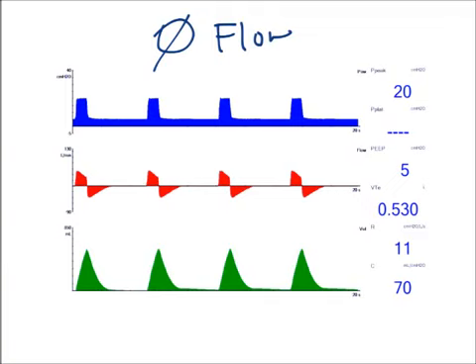If we look at the measured values on the right side of the ventilator, you notice that I have my peak pressure and a plateau, and my plateau is dashed out because I don't have a measured value. And this is pressure control ventilation.